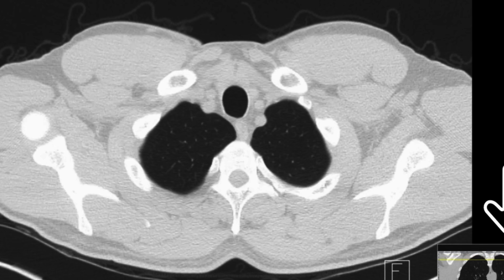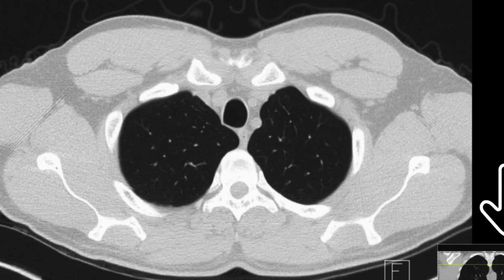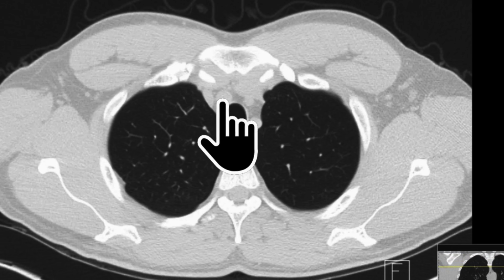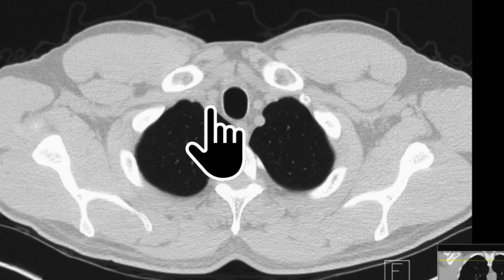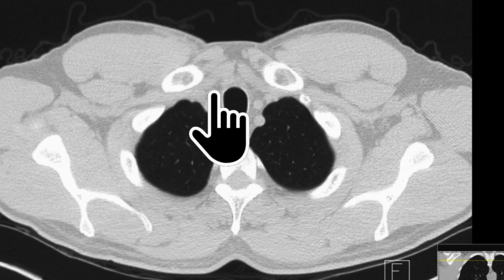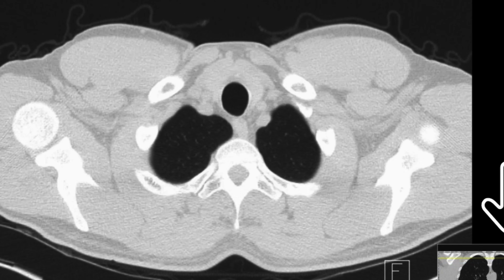Oh, which one was it? It's scrolling down, scrolling down, scrolling down. So this is the brachiocephalic trunk. Split. So I reckon right subclavian artery, right common carotid artery.